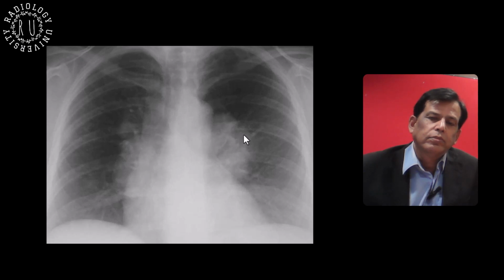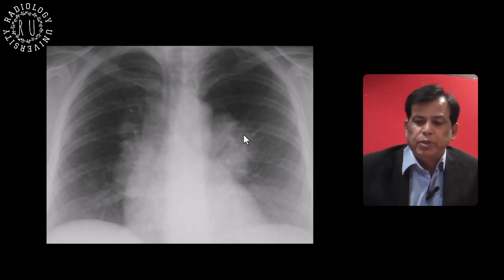To confirm my findings, in my routine practice I would like to discuss with the referring physician to have a cross-sectional image of the patient. So I would like to have a contrast enhanced CT chest. What is your differential diagnosis based on this? Nodal disease, but I cannot see any parenchymal abnormalities. So my differentials would be sarcoidosis, tuberculosis, and nodal metastasis, say lymphoma. Which is the commonest, you think? Sarcoidosis. Does the patient have some skin lesions? Does that make it more confirmed?